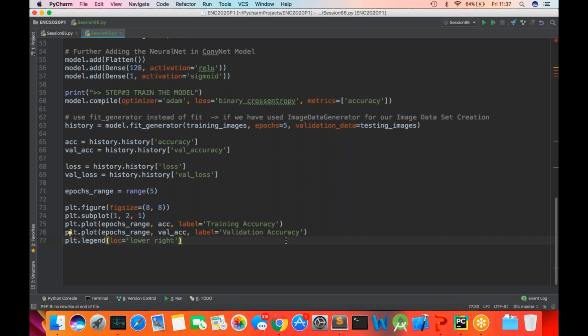So this is for the accuracy, and I'll just give a small title here. So plot dot title, let's say this is accuracy, right?